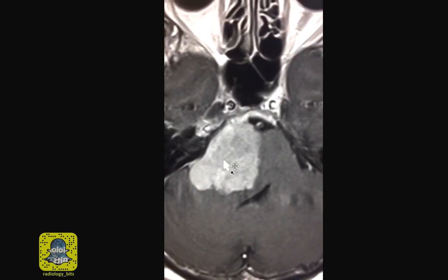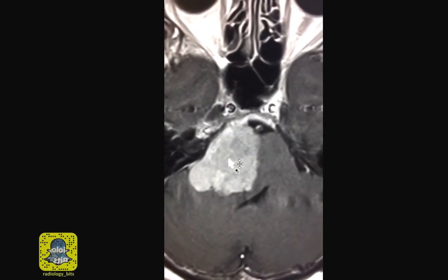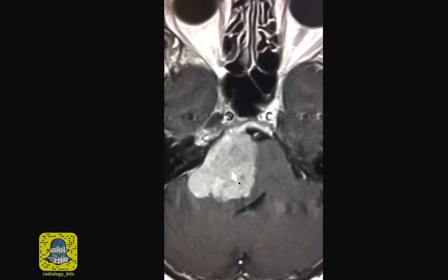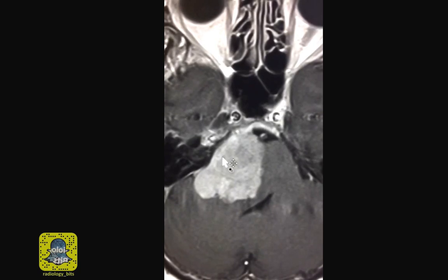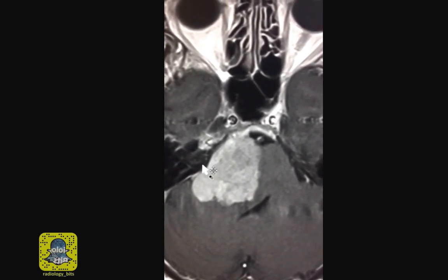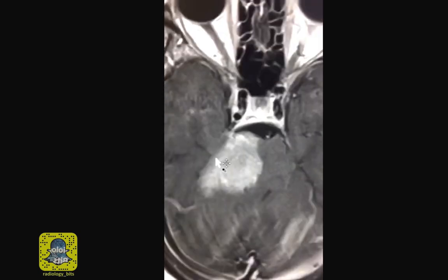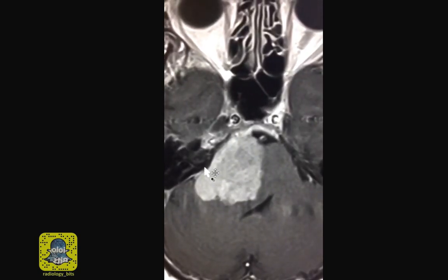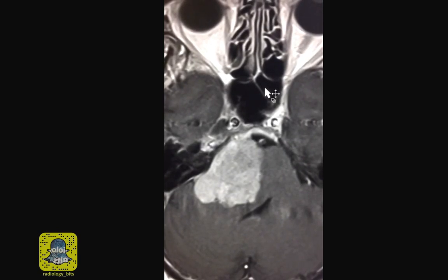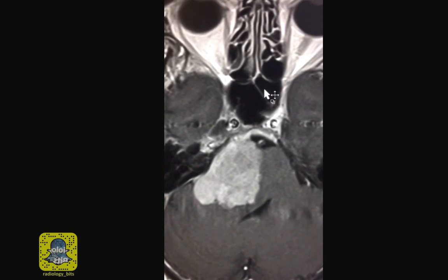Another feature that you could look for is the presence of calcification. We know that calcification, especially if small, could be missed on MRI. CT would better assess that. Many meningiomas adjacent to bone are associated with bone changes, which we call hyperostosis, which is also a feature that is difficult to see on MRI because bone and calcium is better seen on CT. Let me jump quickly to the non-contrast CT and then we'll come back again to the MRI examination.